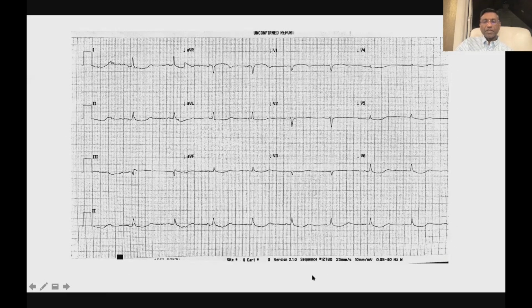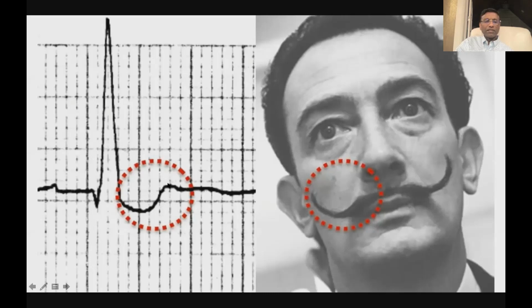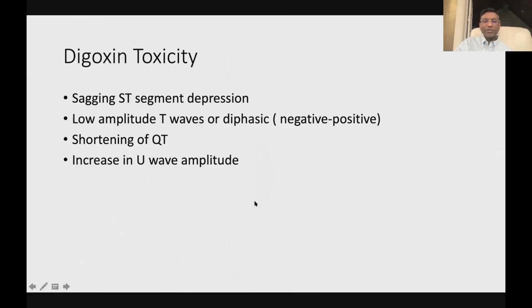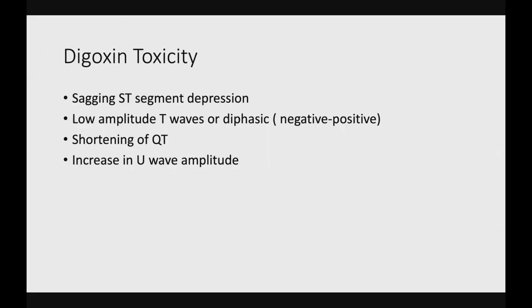And you have this sagging ST segment, classic for dig toxicity. It's supposed to be like the inverted handlebar mustache of Salvador Dali, this artist. And look at that, that's really pretty good for this one, wouldn't you say? So dig toxicity, I'm sure it's going to appear on someone's exam somewhere. So keep that in mind. I was handed this ECG this week, so I thought I'd put that up for you.